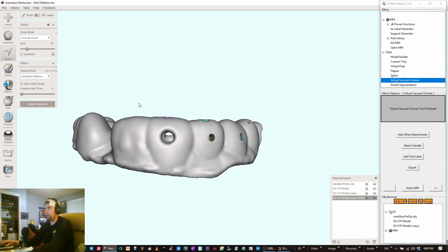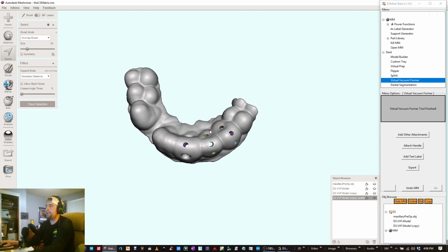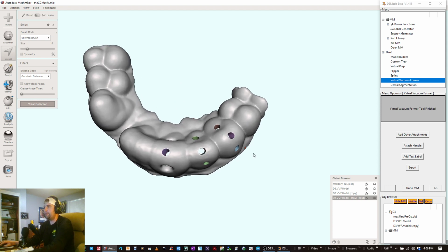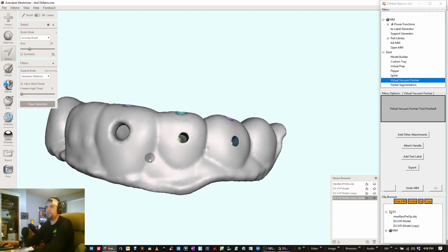And then you say to yourself, well, okay, great, you're all done. Perfect, great job. Way to replicate what Cory Glenn did. But it gets even better. So we have what we have here, but we can even go a step further. I still have my select brush here. I press S to get that tool going. And I think I'm going to make this just a little bit bigger, like 25. And 25 is an arbitrary number. It may be different for each model, but for me, about as small as the diameter of the perforation, maybe a little bit smaller.